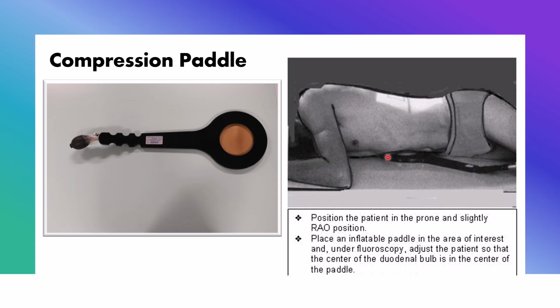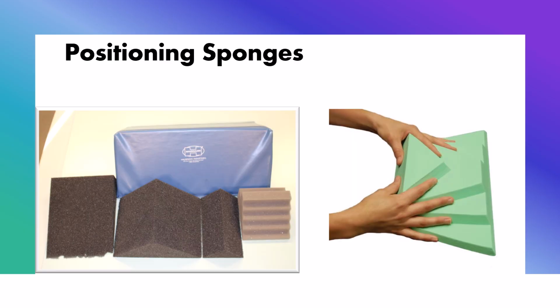As you can see, this is an old picture, but you can see the patient lying on this, so it does not block the X-rays. It has a little ring that you can see, but that lets the X-rays go through. It keeps your hand out of a fluoroscopic beam. If you need to put pressure on a body part to spread something out internally, then you can use this compression paddle, sometimes called a banjo, because it's somewhat banjo shaped.